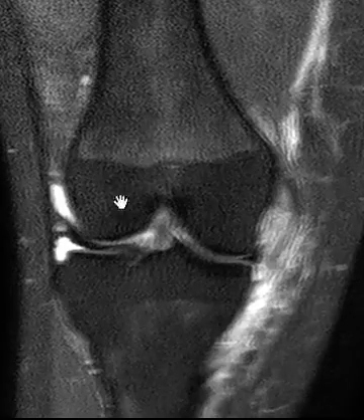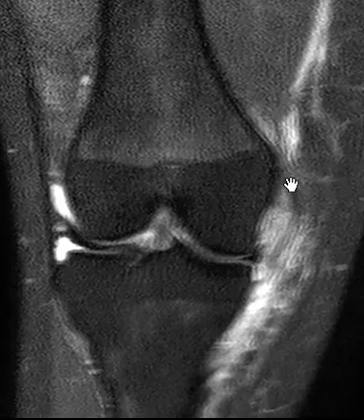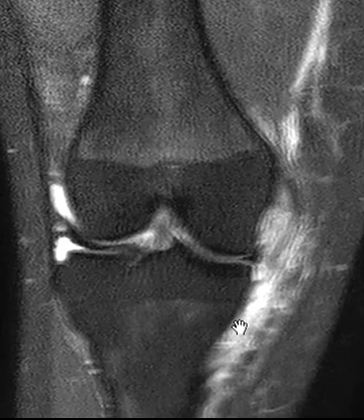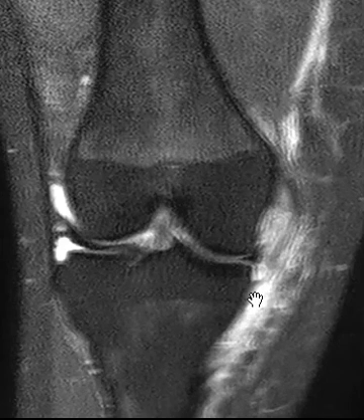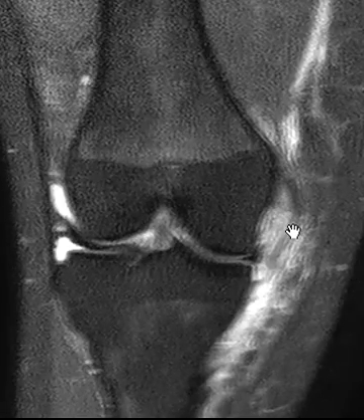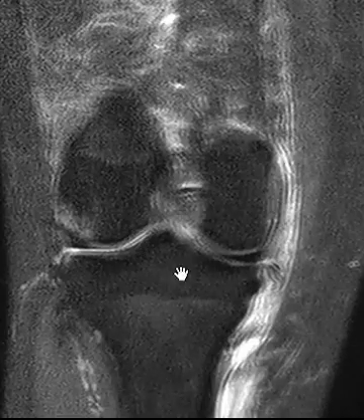If we put up a fat suppressed sequence, we see lots of motion, unfortunately, but the medial collateral ligament, now we can see it's intact up high, and it ends here, and this is fluid, so it looks like it's completely torn from the tibial attachment, another grade 3 MCL injury. It's non-functional.